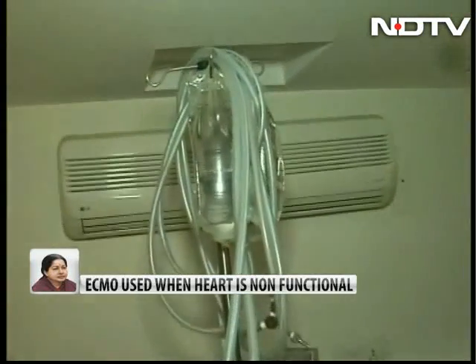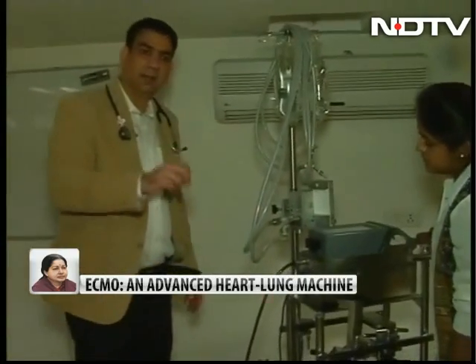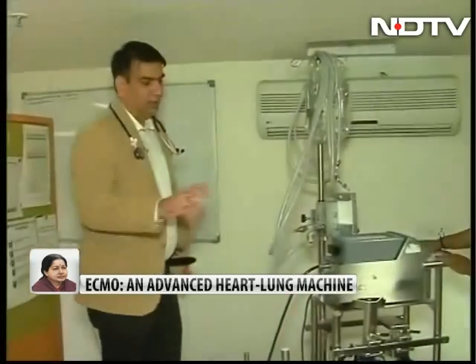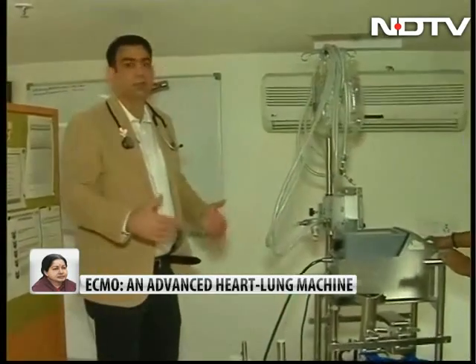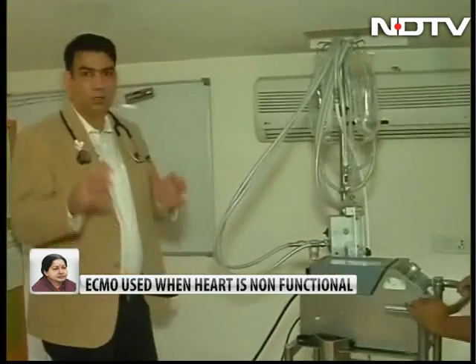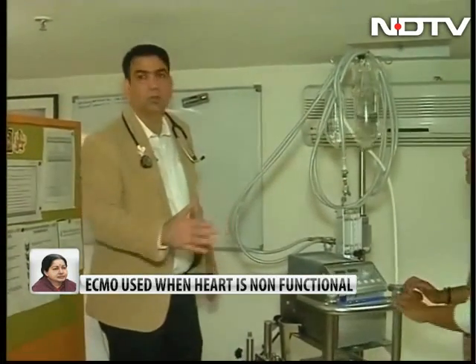There is an oxygenator which is not available here right now, that comes as a part of a circuit, and that maintains your oxygenation, and that's how it supports your heart and lung. It's also known as a long-term bypass machine, because the old bypass machines are only for 6 to 8 hours. This can be used for a couple of weeks.